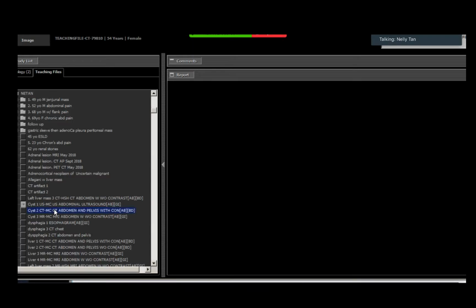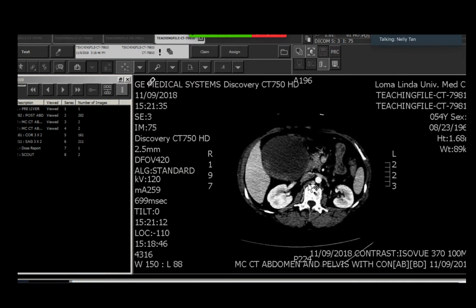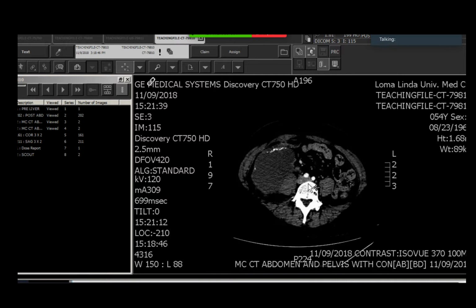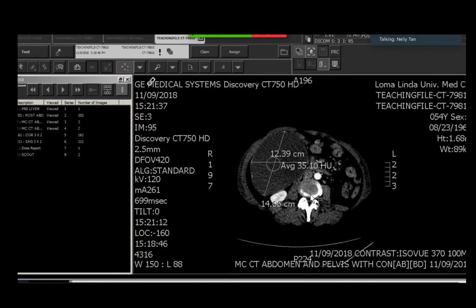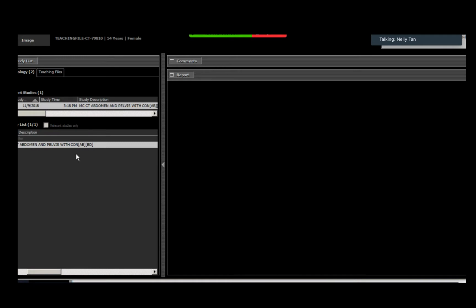So the patient got a CT abdomen and pelvis, and this is what the CT abdomen and pelvis showed. It's just a post only. So we gave a combination of benign and malignant differential diagnosis. Then the patient went on to get an MRI, which is what I read.